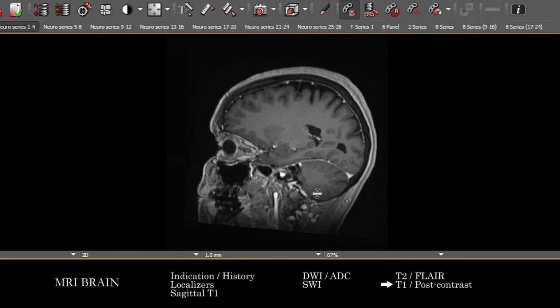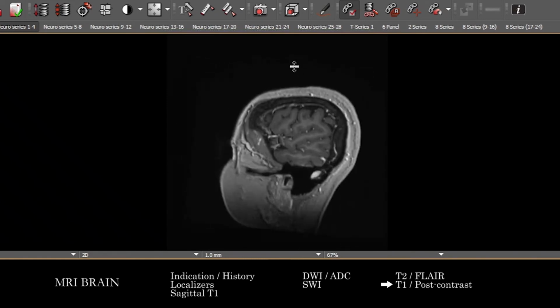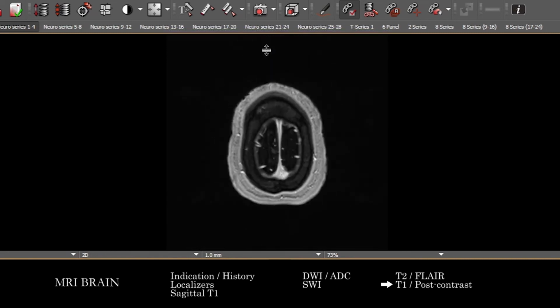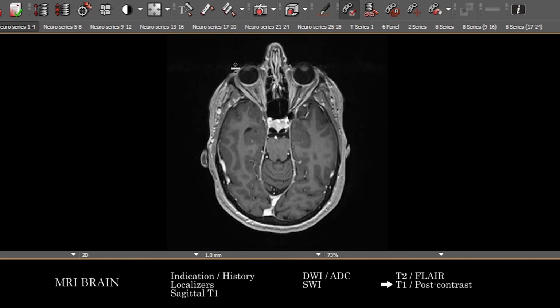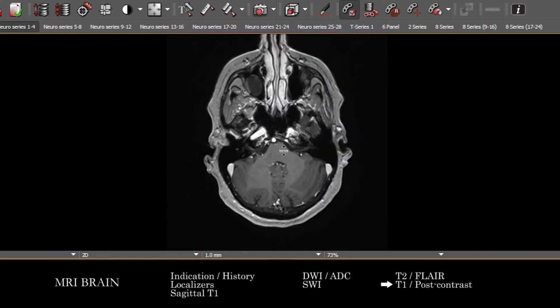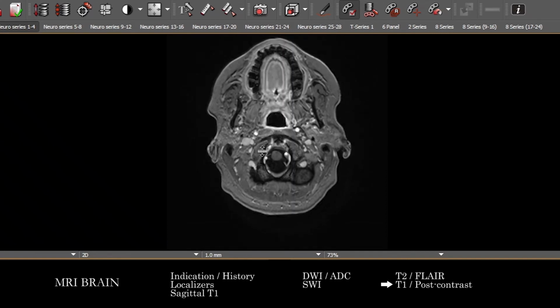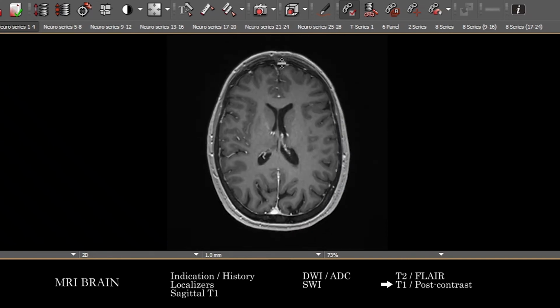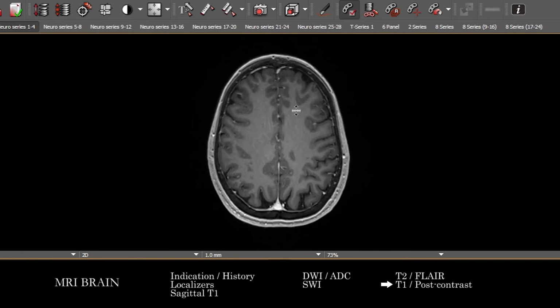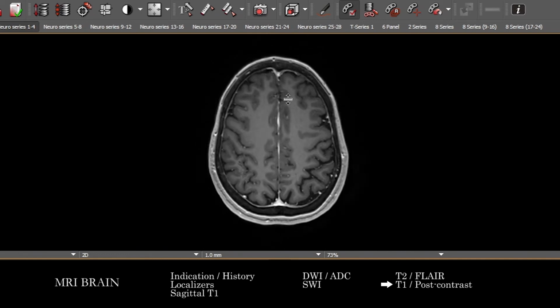this is going to be provided sometimes in multiple reconstructions, as we have here, even though these three, the coronal, sagittal, and axials, are actually acquired as a single volumetric data set. We're going to approach this with a complete search pattern through entirely the extracranial soft tissues, scalp, orbits, upper neck, basically going through that entire anatomy and being very careful to look for any subtle enhancing lesions. Okay, this is frequently one of your higher resolution and higher signal to noise sequences, and especially with post-contrast enhancement, more sensitivity for serious pathology.